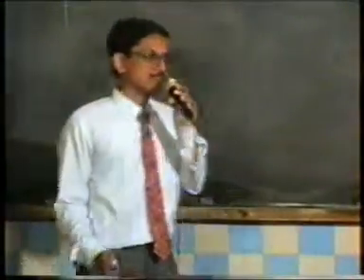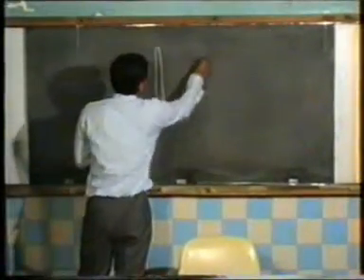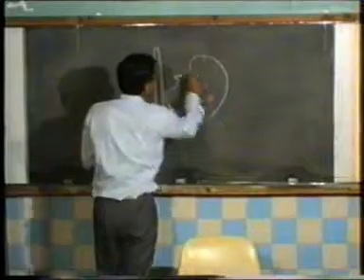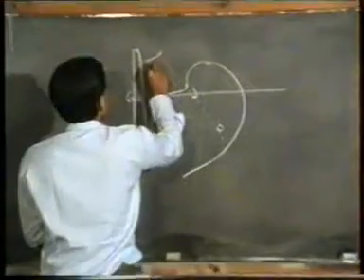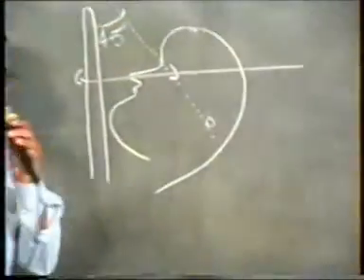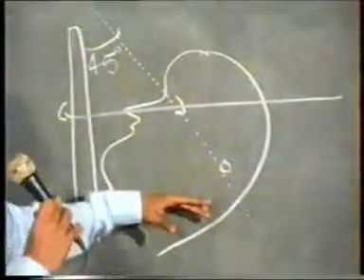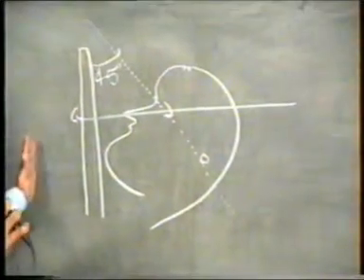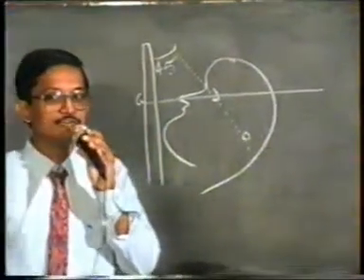The view taken is similar to the Caldwell's view, but the patient's head is given a tilt of 45 degrees so that the petrous apex comes below the maxillary sinus, and the X-ray beam comes from behind to the X-ray plate, which is facing the nose and chin in front. This is the paranasal sinus Waters view, classically seen for the maxillary sinus.